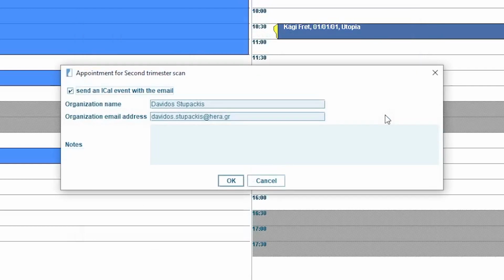the patient can import into her calendar. However, this functionality is not activated by default, as the sending of patient data is strictly regulated in many countries. If you like to use this functionality, please contact our sales team or your local Astraia partner for a free license. There are various possibilities for moving an appointment.